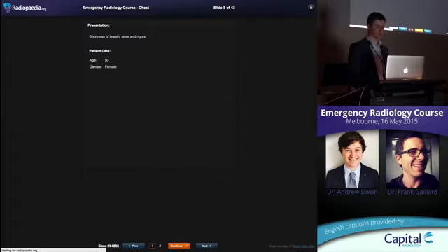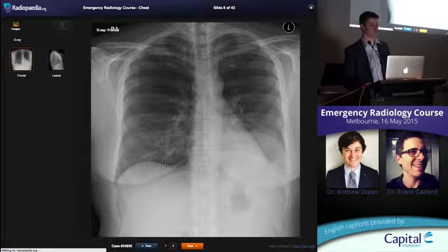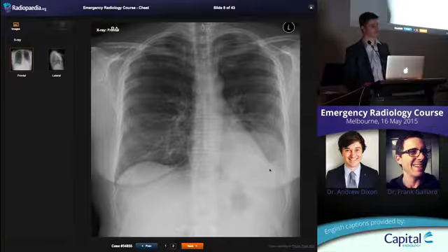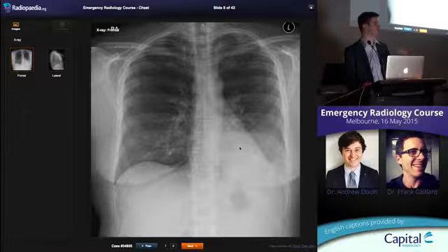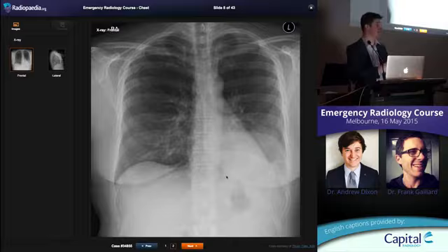So shortness of breath, fever and rigors. So we're thinking they've got pneumonia. And we look on the PA chest radiograph here. You can see this right hemidiaphragm perfectly clearly. Left hemidiaphragm you cannot make out at all. Now there's a generally increased density to this lower zone, so most people would probably spot that anyway, but there are a lot of left lower lobe collapses and consolidations that are missed in the emergency department because people think, oh, the heart is supposed to be there, it's supposed to be dense, so I can't really assess that area, but you can.